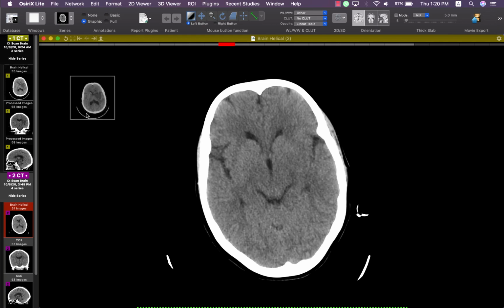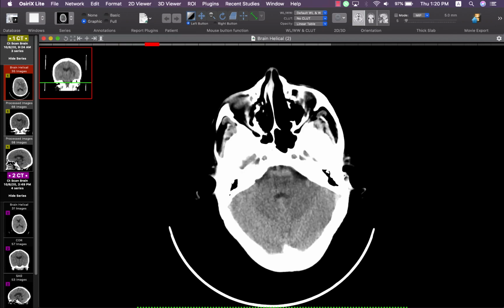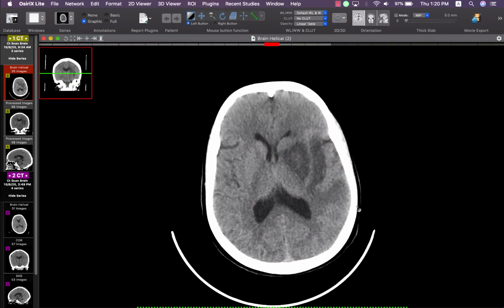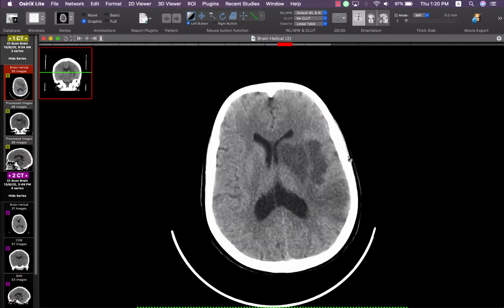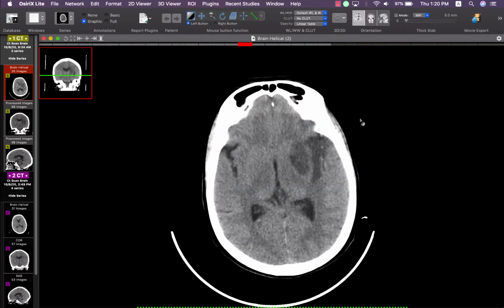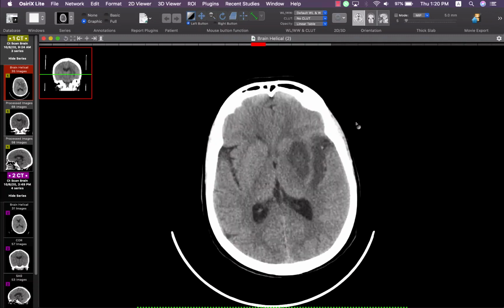This patient had a follow-up CT brain after a few days, and we can see here a hypodensity in the basal ganglia and the region of the left cerebral hemisphere along the territory of the middle cerebral artery. So this is a well-established infarction.